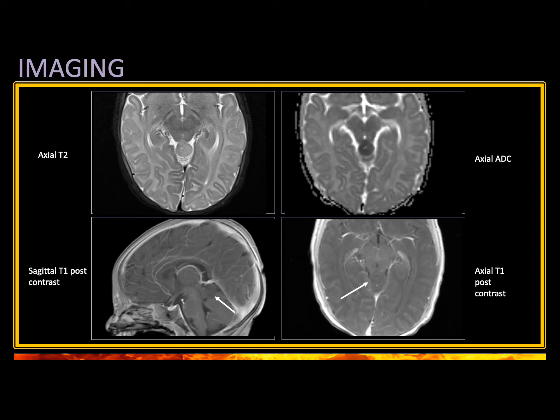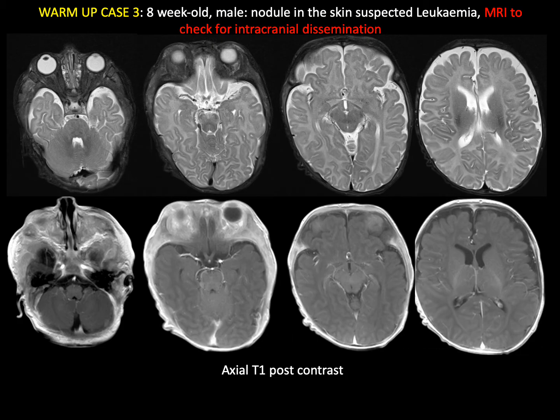You can see here we will not be able to distinguish between hyperintensity due to the fat and the presence of an enhancing lesion in the scalp. Why? Because the hyperintense signal of the fat overlaps with the contrast. So we do have a problem, and the same happened in this other case.